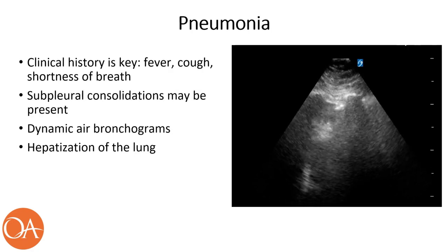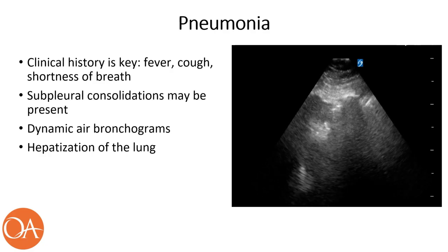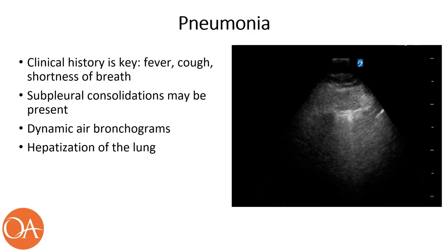When assessing pneumonia through lung ultrasound, it is essential to take into account the clinical context of the patient. Common presenting symptoms include fever, cough, and dyspnea. The following sonographic findings are suggestive of pneumonia. Unilateral B lines. These findings are particularly significant when they are restricted to a single lung zone. In instances of multifocal or bilateral pneumonia, as often observed with viral infections, B lines may be evident bilaterally.